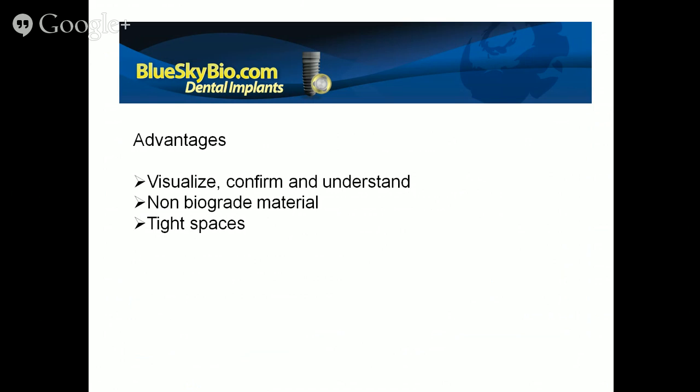The advantage of the model-based technique is, first of all, it's very easy to visualize, to confirm, and to understand the process and what you're looking at. You get the model with a post, you put the metal cylinder on top of it, you do your own vacuum press. Everything is very clear, very obvious, very intuitive. You could see exactly where the metal cylinder is going to be. Everything is very clear and easy to understand.